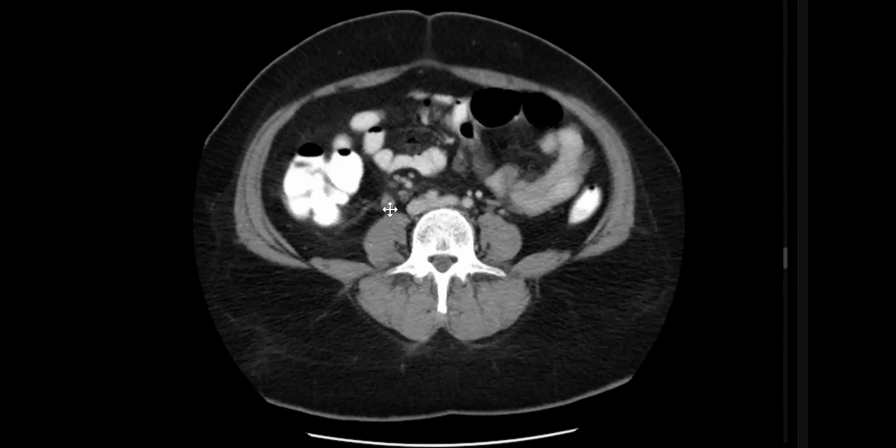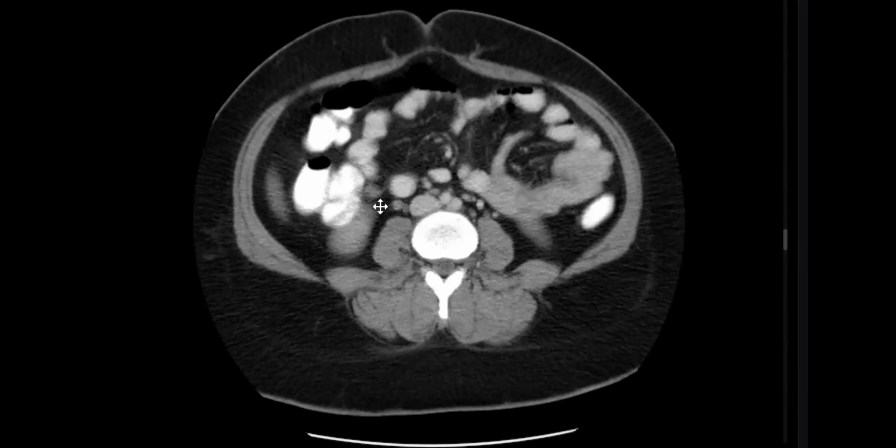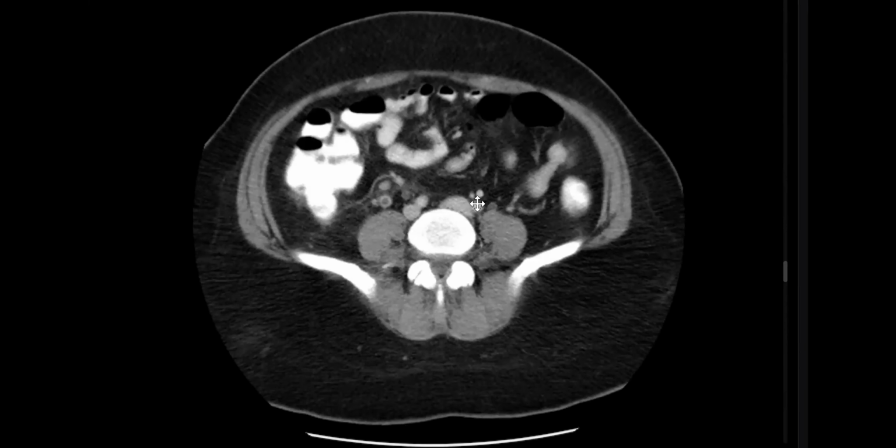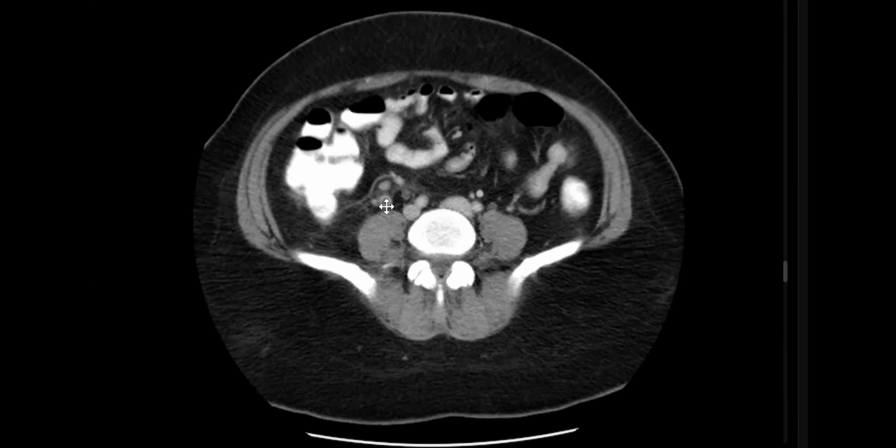Down, down, down. Very good, my friend. We have a filling defect and smudging of the fat planes around. Unlike this one, the left ovarian vein is of normal caliber. Away from this case, in a patient with vaginal bleeding or unexplained chronic pelvic pain, we should assess the left ovarian vein, which is commonly enlarged and shows reflux. Okay, back again to this thrombosed vein.